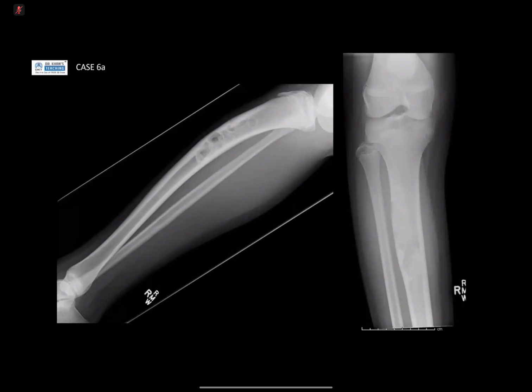You don't know what it is, and that's okay. That feels uncomfortable, but that's okay. You're trying to develop a safe framework. So when are you worried and when are you not worried? If you're not really worried, you can see that there's bony deformity, there's bowing of that tibia. And actually, if you look really hard at the anterior cortex on the lateral view, can you see anything along the anterior cortex? Yeah, I see a lucency.